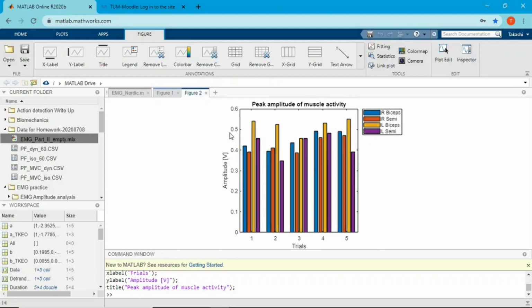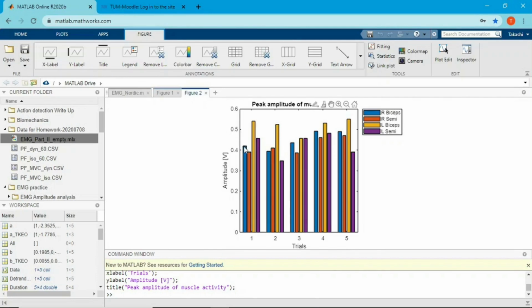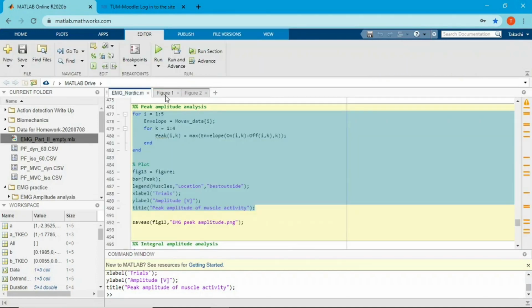So what you can do is take out all values of right bicep femoris like I did right here, create a variable called envelope and extract the data, and you just divide those values by the peak value. You just pick one of them, this peak value, or this one, this one, and you just divide the values of right bicep femoris in other trials by the peak value.